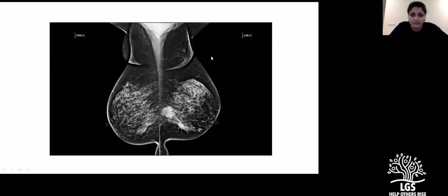But are there any small spots here? No, I think not. There's axillary tail there, accessory breast, but nothing within that. It's very important, when a woman comes for a mammogram, we might end up seeing artifacts. If they put a lot of talcum powder, particularly under the breast and in the armpits, we have to instruct them not to use talcum powder when they come for a mammogram.